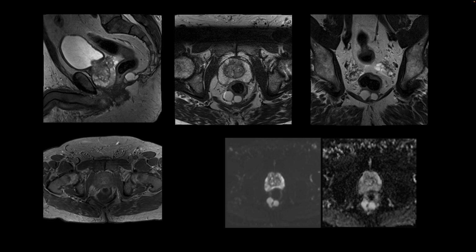This is our next patient, and here we have performed an MRI of the pelvis to evaluate hypodensities or cystic foci that were previously seen on their CT of the abdomen and pelvis behind the rectum and close to the coccyx. And so as we look at the small field of view T2 weighted images, we find these T2 hyperintense densities that are abutting the posterior aspect of the rectum, and also the musculature and fascia that is anterior to the coccyx.